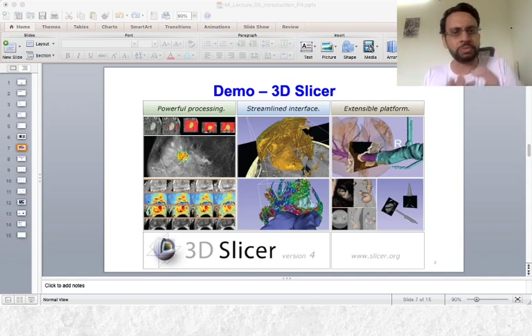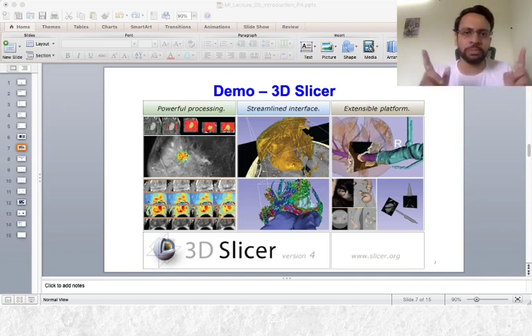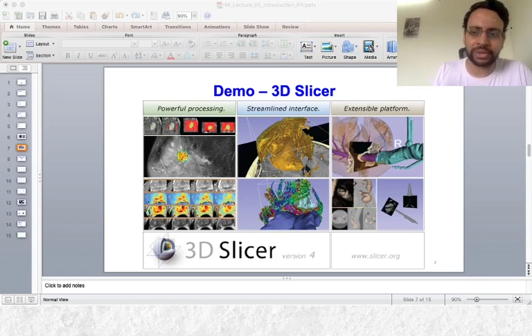You could pick each module that you would like to want, and then you could write a very nice program here. This follows the concept which is commonly referred to as extreme programming. That's done in C++. Somebody who would like to get a mastery over programming in medical imaging, this is a strongly recommended tool. And then again, lot of algorithms for segmentation are also there. Let's say region growing algorithms, watershed based segmentations, level set based segmentations, and some hybrid methods as well.